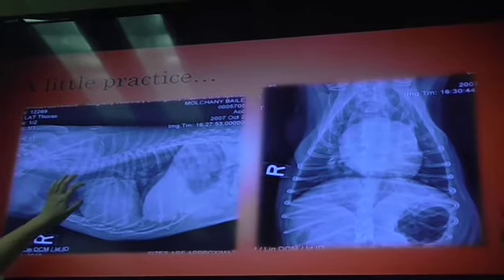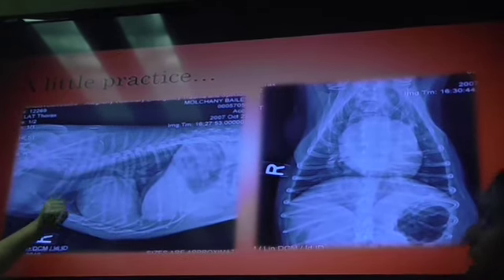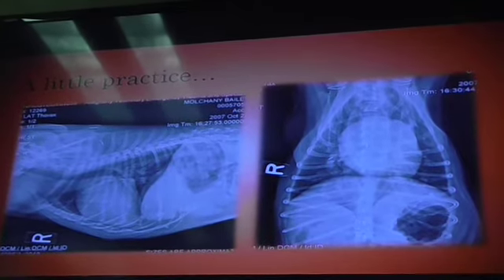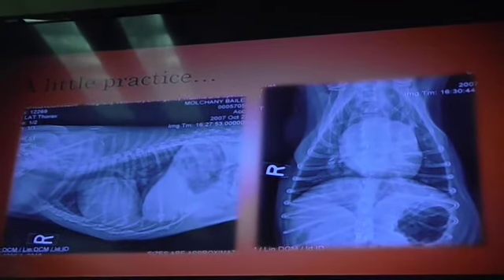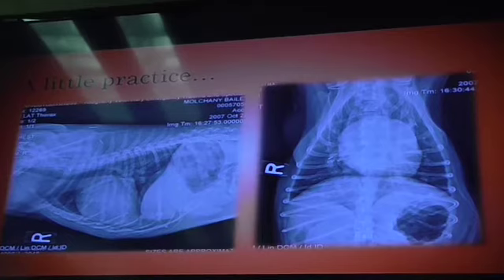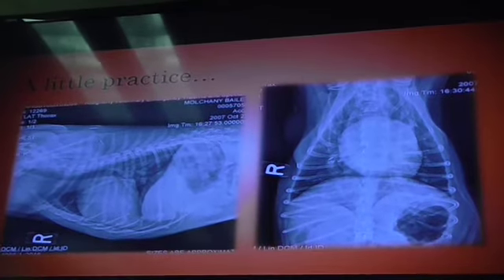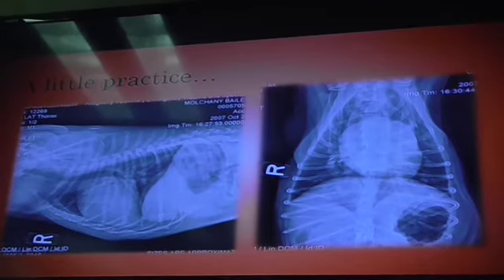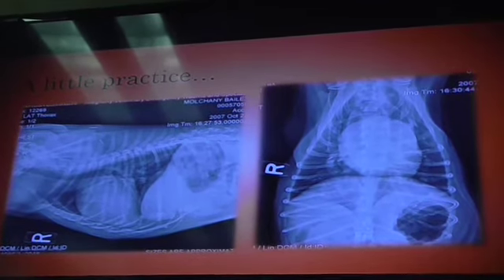So you said this was an artery, bronchus, and this is... So remember you have a left and a right side, okay? Artery, bronchus, vein. When they sit on top of each other, they sit kind of like this. Artery, bronchus in between, vein; artery, bronchus, and vein, they superimpose from the opposite sides.